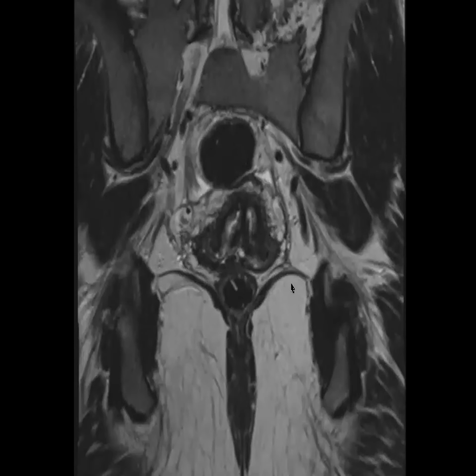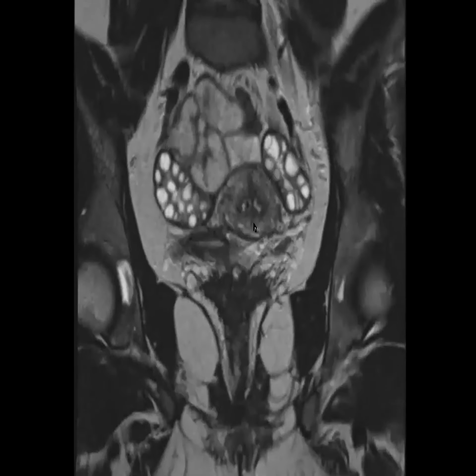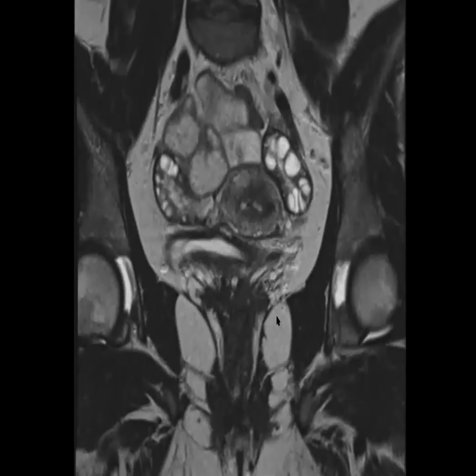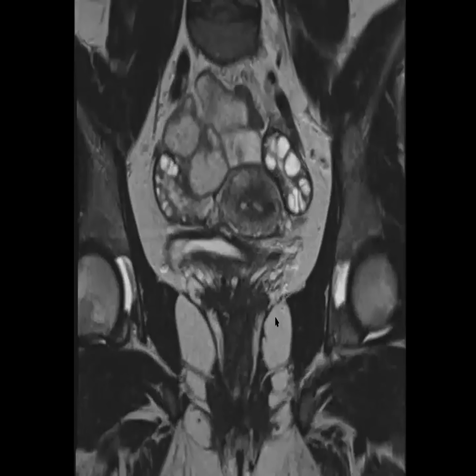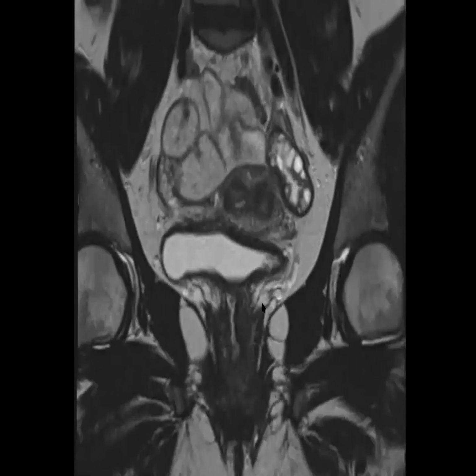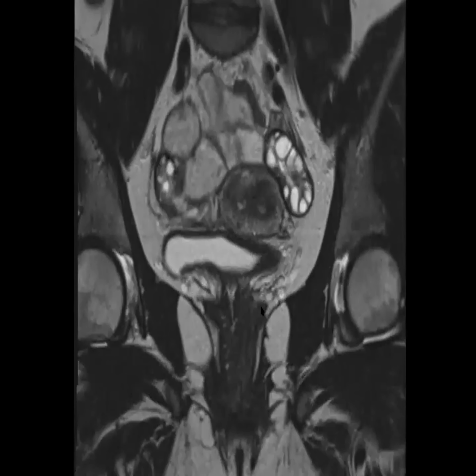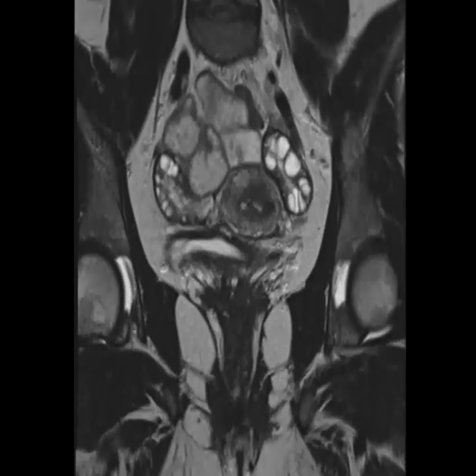This is also courtesy of Omar. Thank you, Omar. Of a didelphys below with two cervices, two vaginas, and then it gets fused up here. And then this part was actually like a septate uterus. So you can actually even get combinations of this on the spectrum. And I think it's because the two sides are fusing. And so in this particular case, they just didn't fuse below, but they fused above, but they still have a muscular appearing septum above. And Rupa says none of these read the book. Yes. And some nice ovaries here. So, okay, that's it for me.